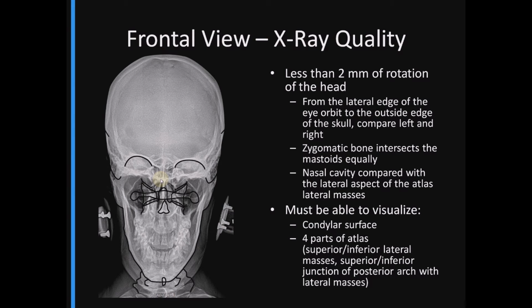Therefore, it's less reliable. We do need to be able to visualize the condylar surfaces here and here, and we need to be able to see the entire atlas.